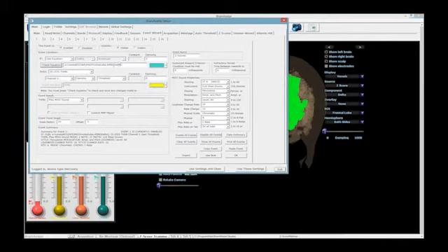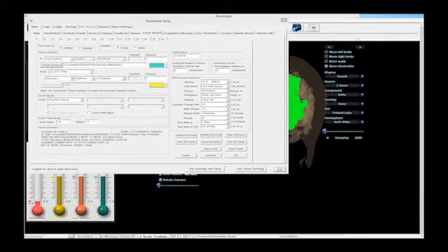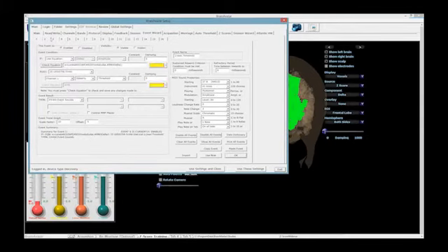Now, because there's a lot going on in this protocol right here, one of the things that we've added as a brand new feature is the ability to not just use your noggin to basically choose, okay, well, I want to train this today and I want to train this today, especially with this protocol. You're going to have to change the region of interest and the band in 4 different event wizards. I'm sorry, I tried to make it a lot easier for you guys, but that's the only way I could get the best results out of it. So now, as opposed to having to change this every single time you would want to change something like that, we built in new features.